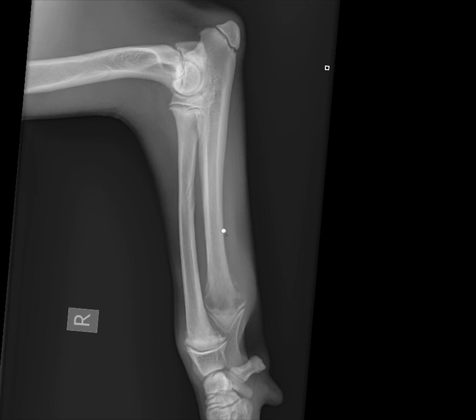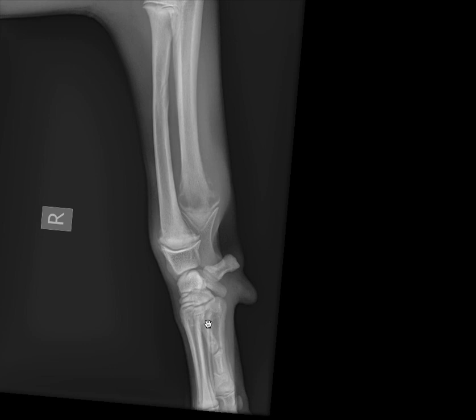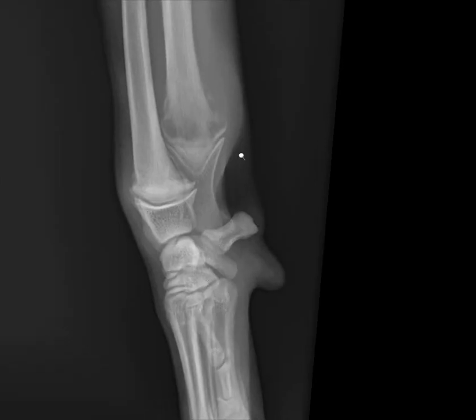Cartilage is maybe a simple way of saying what I really want to look at are the entire radiographic joint space and periarticular margins. C for cartilage fits in the mnemonic really well. When I do C for cartilage or assess the joint space, I again look at the subchondral bone plate of the epiphysis of all of the bones, including the long bones and the cuboidal bones.